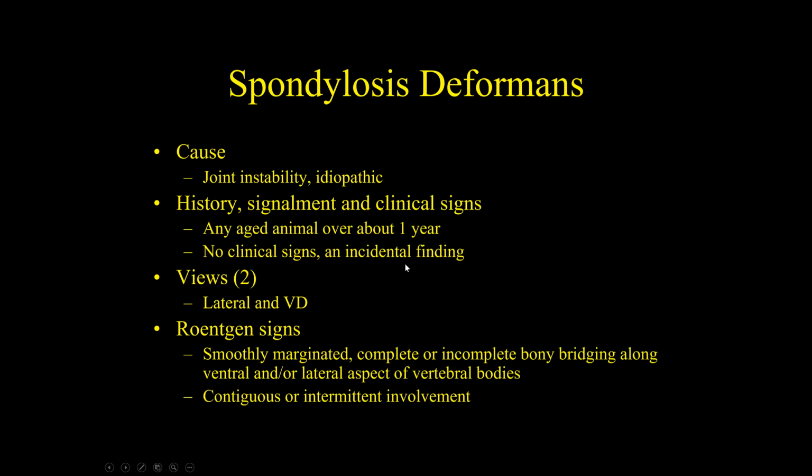Okay, the next thing we have to venture off into is 3 different terms that you have to get straight going forward, that you just have to memorize the names and what they are and do they cause clinical signs or not. This one here is called spondylosis deformans. You will also hear other people call it spondylosis, just for short, okay? And I'll show you some pictures of it.